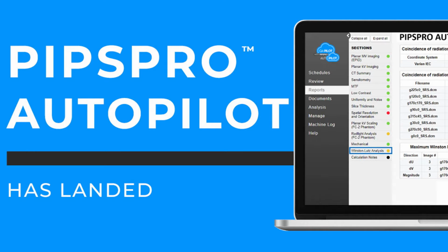For your TG142 imager and machine QA, PIPSpro AutoPilot will automatically analyze uploaded image files and display the results in the assigned TG142 schedule. No manipulation of images is required. No need to mark fiducials. No need to define analysis regions. It's all done automatically.